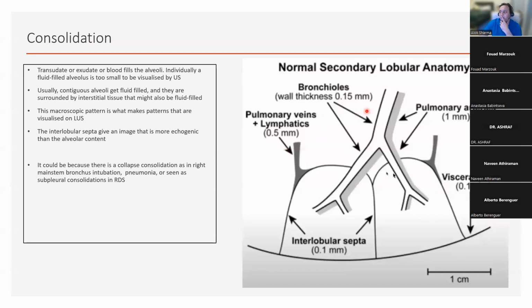But if you have fluid in the bronchial tree because of infection, pus, pulmonary hemorrhage, or a variety of other reasons, like a right mainstem bronchus intubation, so no air is actually entering these areas, then gradually fluid and exudate will accumulate, which will block this area off. Naturally, air won't be able to enter. And if that is the case, these alveoli will collapse.